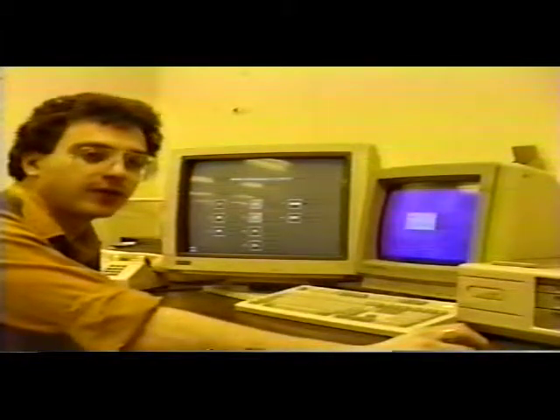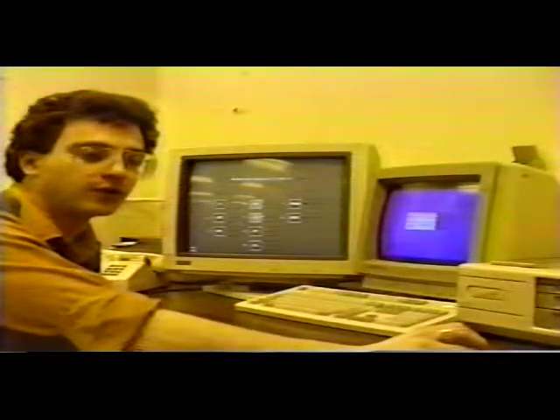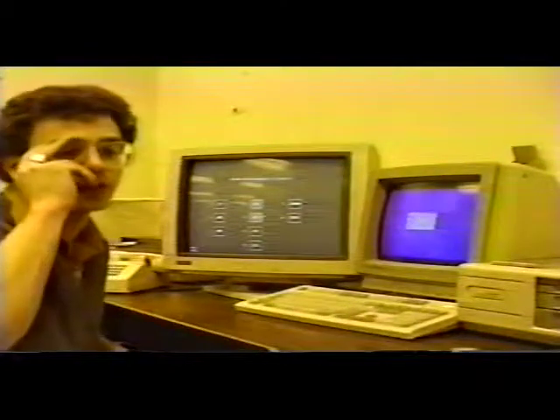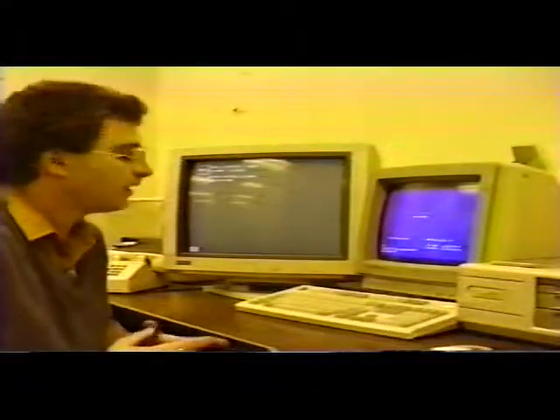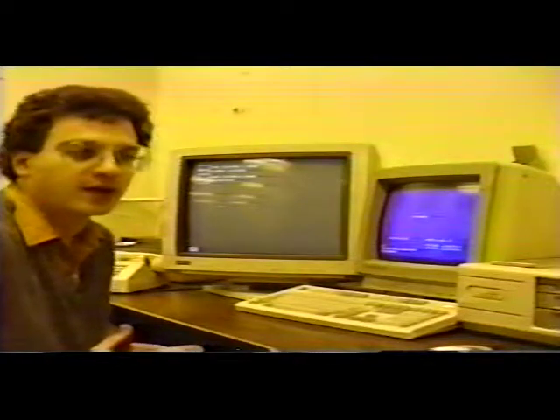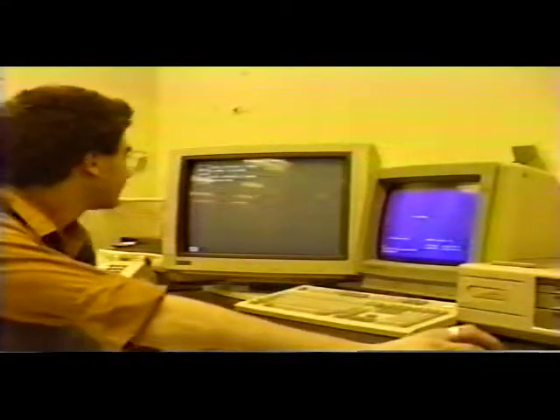The decision was made early on in the design of the system not to have things moving around and changing very rapidly or from session to session on the screen. We try to keep things as consistent as possible. Clicking on CT lets you view the CT or CAT scan studies that are on the disc. And we're told that there are 2 CAT scan studies. They're presented most recent first.